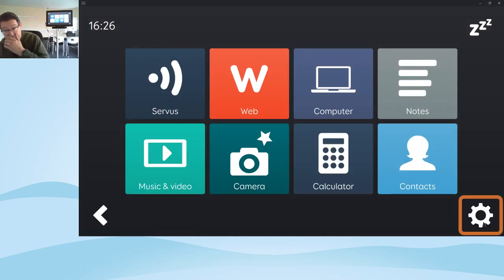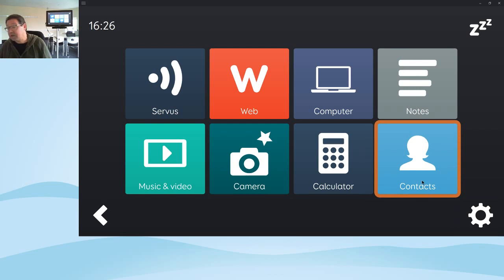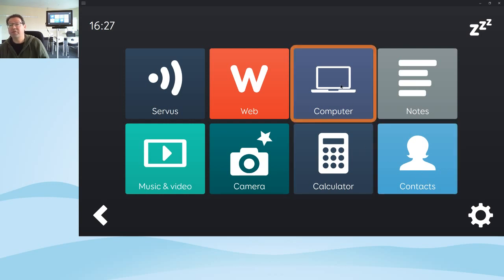So we have grids for lots of common things that you will want to do, like Twitter, Facebook, and email and that kind of thing. But there are sometimes when you might want to control another piece of software that either there isn't a grid set for, or it isn't accessible enough to allow you to control it via a standard grid. And in that case, it's possible to use Grid 3 to control any other piece of Windows software.